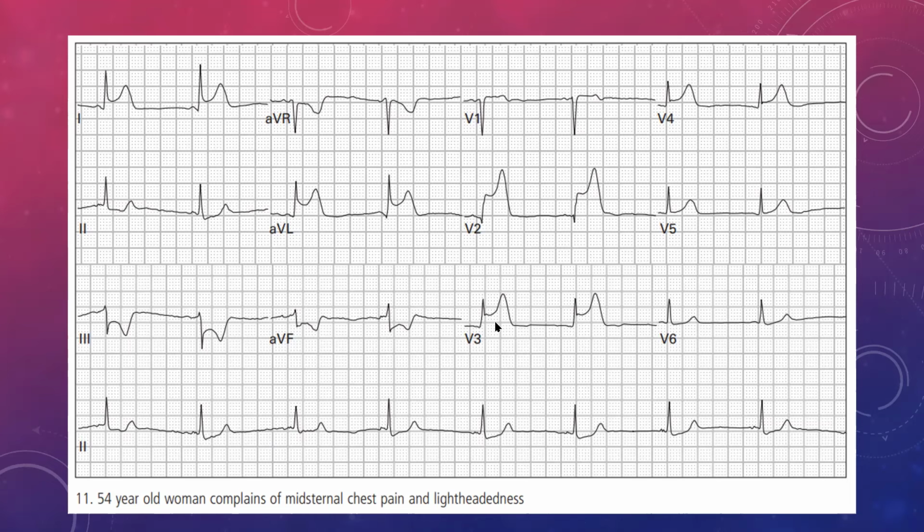Now, there is an exact formula that you can use to work it out, but I'm not going to bring it up here because the majority of the time working in an emergency department, that's not really going to be your first point of call. It's really once you're working in internal medicine and cardiology that you're going to use that formula to work out exactly how bad it is and exactly where you're going to place the patient in your cardiac care unit and things like that. That's where it comes to.